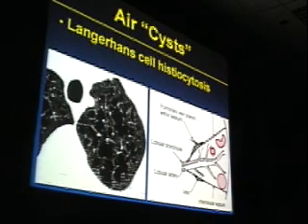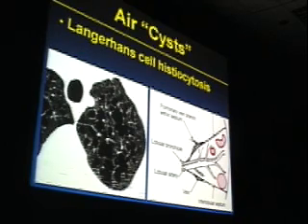Now, the variety of lesions that you may see in patients with LCH include irregular cysts, which may be either thin or thick-walled. You may see nodules, which are typically centrilobular in distribution, and you may see cavitated nodules in the same patient. Distribution is relatively homogeneous, axial to peripheral, but this disease tends to involve the upper lobes of lung, as you know, and the vast majority of these patients are smokers. That's right.